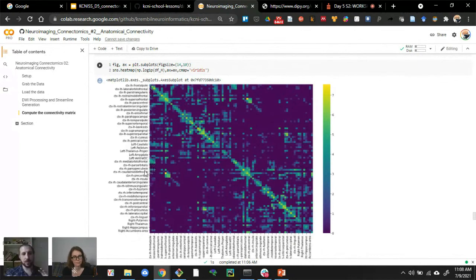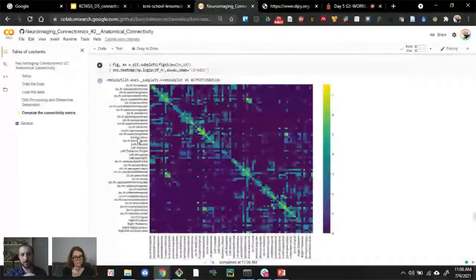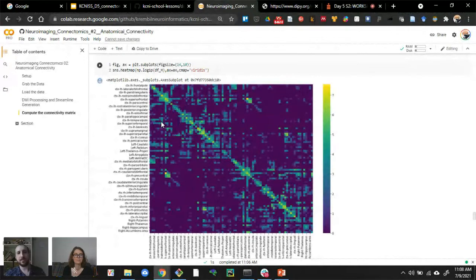So when we have this ordering, left hemisphere then right hemisphere, first half left hemisphere, then second half right hemisphere, that's when we get these 4 blocks. This particular block structure in a connectivity matrix: the top left-hand side, the first quadrant, all of the entries in this matrix here, these are connections that are within the left hemisphere. Left hemisphere nodes, they're streamlines that are connected to other parts of the left hemisphere. Then the bottom right is intra-hemispheric as well, but for the right hemisphere.